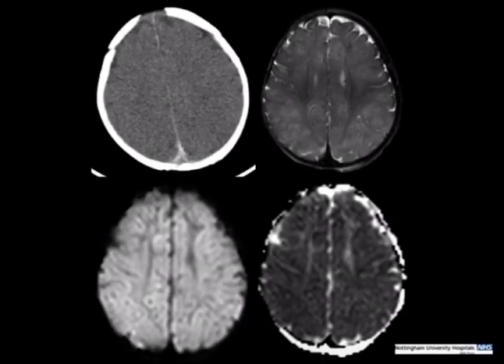It wouldn't be a paediatric neuroimaging talk without some non-accidental injury, unfortunately. So just a quick reminder that the diffusely abnormal scan can be an easy one to trip up on. This is a 2-month-old who apparently had a cardiac arrest while feeding. Obviously on the CT, the brain looks a bit featureless, difficult to see grey-white matter differentiation, but can sometimes look a bit like that anyway.